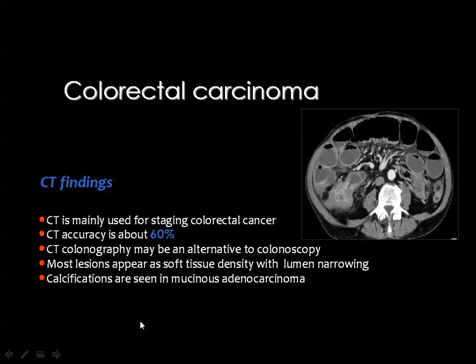And this may be also identified by CT scan. And you see, this is the region of the terminal ileum, and this is the region of the cecum, and you got proximal small bowel obstruction with multiple air fluid levels. Of course, you may mistake this appearance for typhlitis or even inflammatory conditions, but the clinical data and further evaluation by endoscopy is very important.